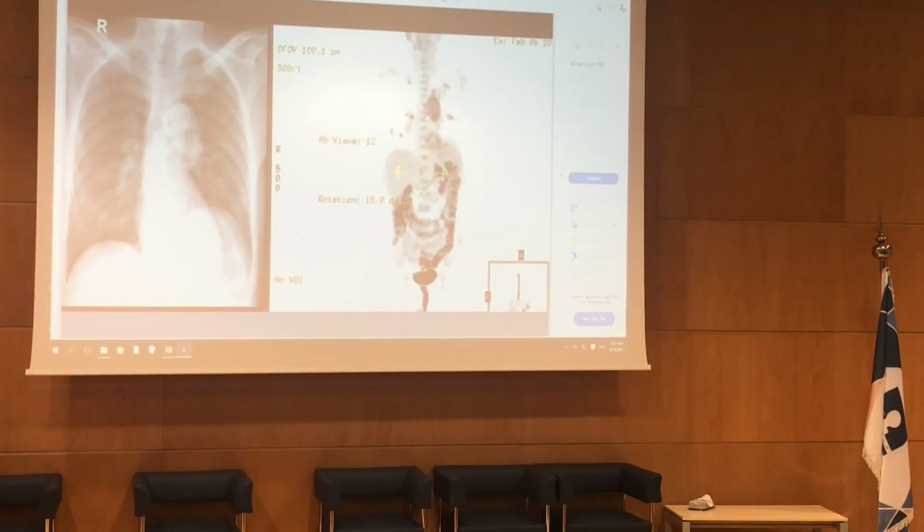This is bronchogenic cancer. Okay, you see here, and there is an additional large mass at the hilum, another mass here, and then the PET-CT shows multiple nodules, right, here and there. And you see why the left hemidiaphragm is elevated this way. Because there is loss of volume. The presence of the mass here has collapsed part of the lung, right? So when there is lung collapse, the left hemidiaphragm will shift up.